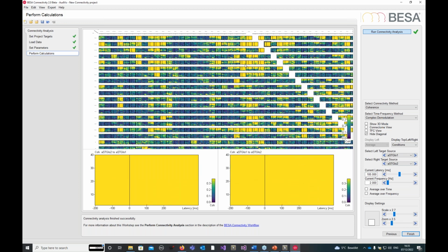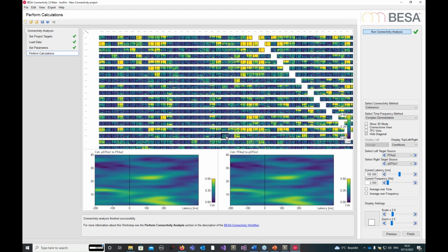And then I can already see that some channels have a very high coherence, especially at high frequencies, and this is exactly the issue with coherence. In this case I don't have the volume conduction as such, but I have the problem with the spatial filter: noise that I haven't modeled will distribute in the same way over various channels and then come up as a mock coherence. So I should focus a bit more on the lower kind of activation.